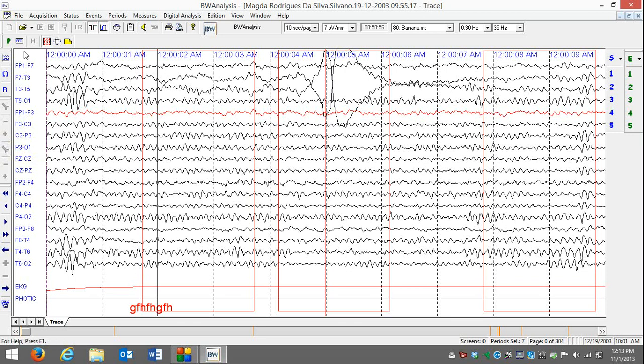Okay. We also have a hyperventilation protocol, which basically the tech selects this button and automatically documents start hyperventilation, and every 5 seconds it documents hyperventilation 5, hyperventilation 10, hyperventilation 15, all the way up to 180 seconds or the pre-configured length.